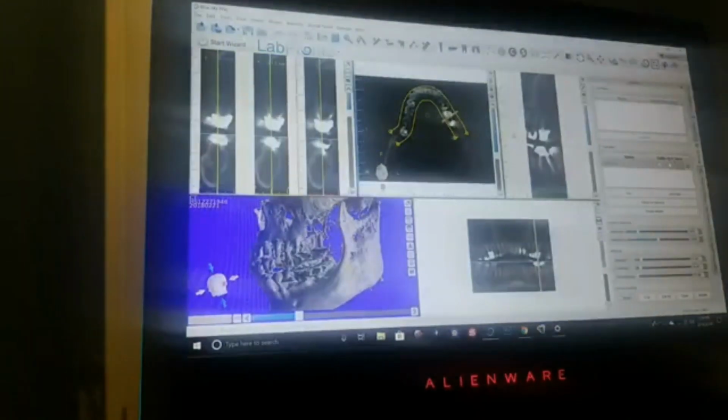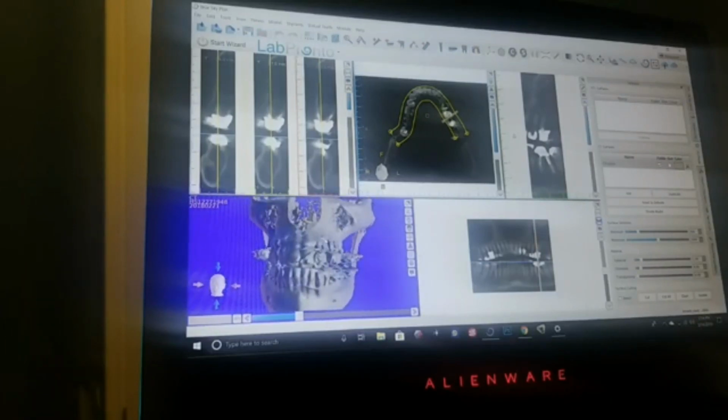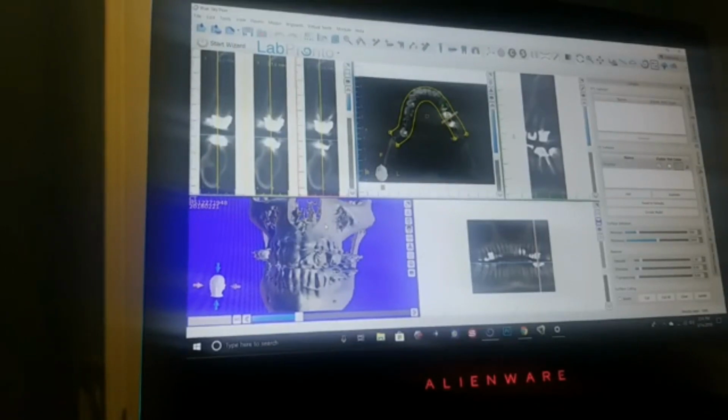But again, let's try to concentrate on how to process our CT scan. This is what I want you to do all the time. When you are about to treatment plan the patient, step back for a second and do these steps first to reset your entire CBCT on a simulated program, so you are ready to look at and plan your case and have all the information that you need for a specific patient.